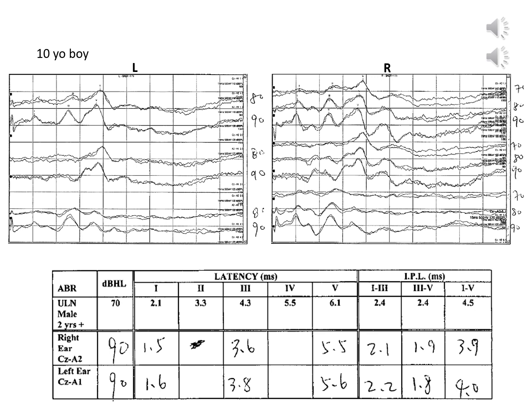And so looking at these numbers, it does look like brainstem conduction is normal because our interpeak latencies were all normal. But what is abnormal in these recordings is that 1-5 amplitude differential, so the fact that the wave 1 is 50% smaller than the wave 5 flags us to the possibility of a sensory neural hearing deficit. And this differential of the 1 and 5 amplitude is much more pronounced in the left ear than the right ear.